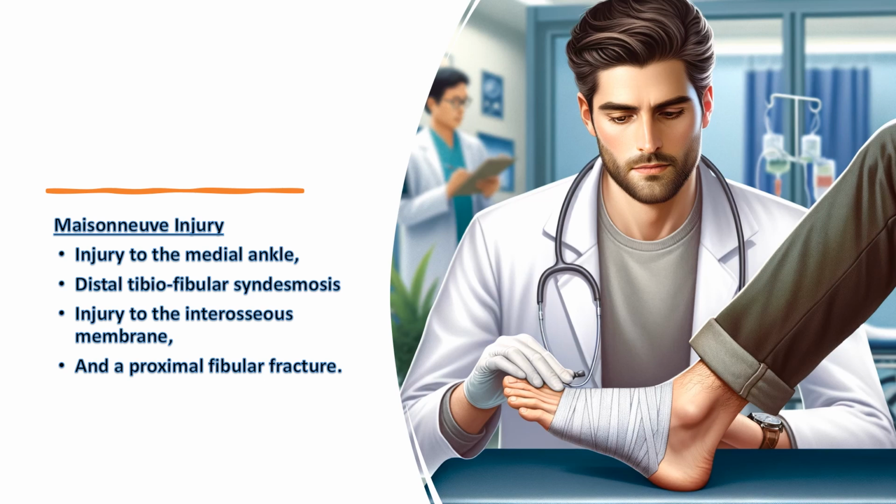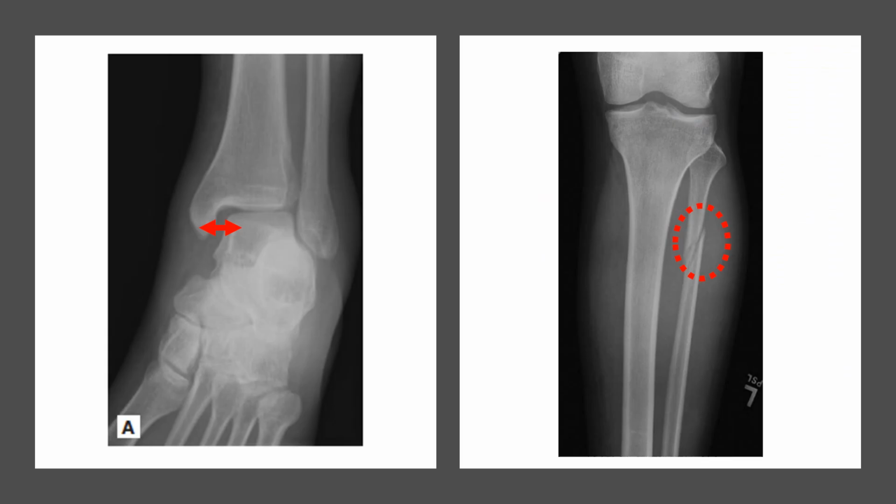In the ER, stabilize the ankle and perform radiographic imaging of the entire length of the fibula. Refer to orthopedics for surgical management, as these injuries often require operative intervention. Looking at the X-rays, we note that there is a wide gap between the medial malleolus and the talus. This is an AP view, with no obvious fracture seen. This is always a worrying sign.